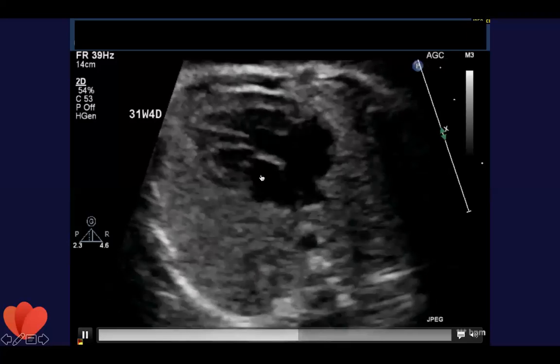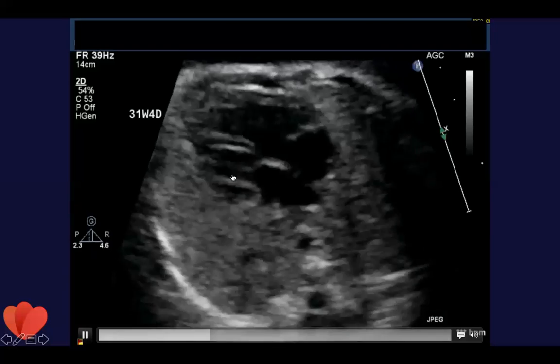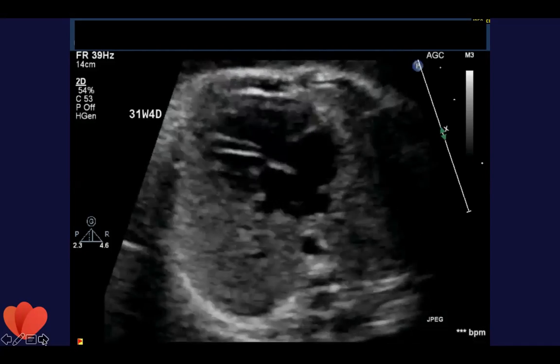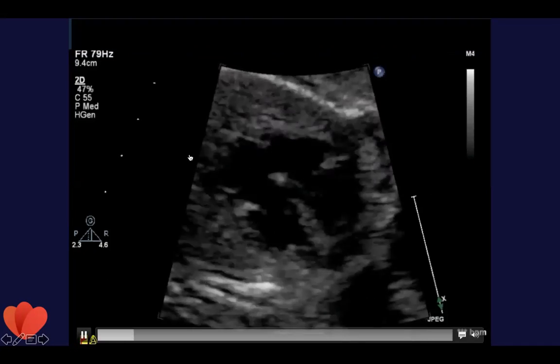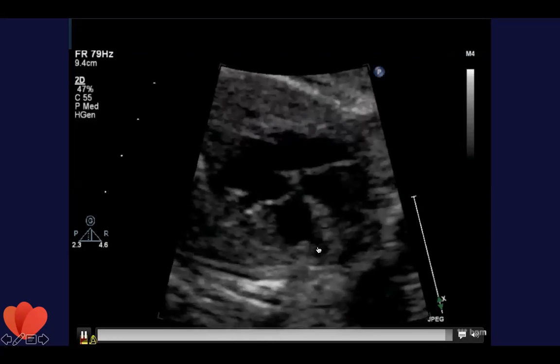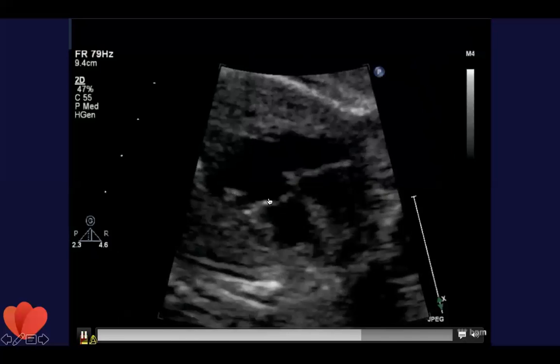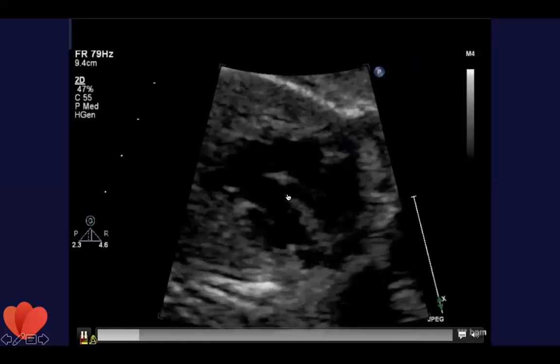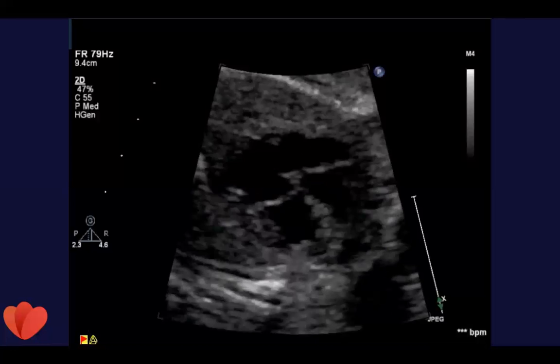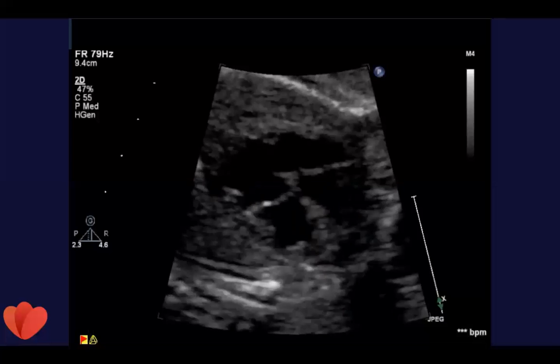And you can see that this valve is more apically displaced than this valve. So that's teeing you off that this could be a tricuspid valve. So now looking at the upright view, I think you can nicely see again, here's your spine. Here is your moderator band that would make it a right ventricle on the left side. And you can see that this right AV valve is apically displaced, more consistent with a tricuspid valve. So this is showing you that your right ventricle and tricuspid valve, because usually the ventricle goes with the AV valve. So if you have a right ventricle, you should have a tricuspid valve connected to it.